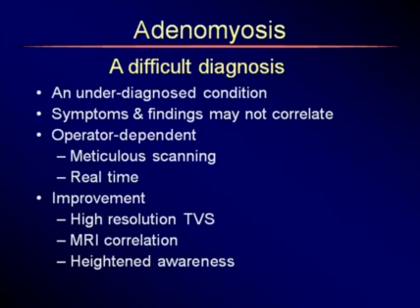Years ago, this was not even a sonographic diagnosis until we developed better equipment, higher frequency, higher resolution, transvaginal scanning. We were able to start seeing things. And you always have to remember that you see what you know. So once we knew about it, we started looking for it.